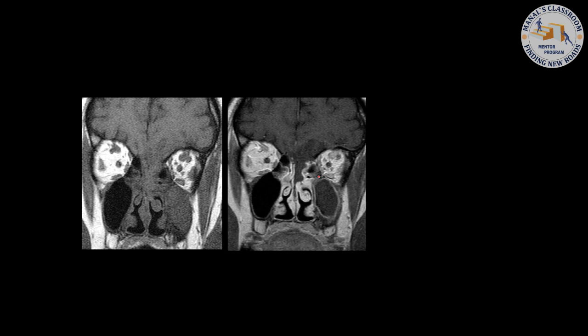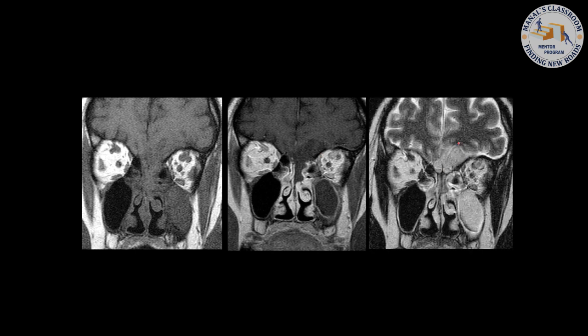This is one case that still haunts me. This was a patient that had invasive fungal sinusitis. And I remember talking with the neurosurgeon in this case. We can see there's something wrong here involving the sinus. It actually grew into the nasal cavity through the cribriform plate. And when we look at the T2 weighted images, there's a lot of cerebritis here involving that frontal lobe.